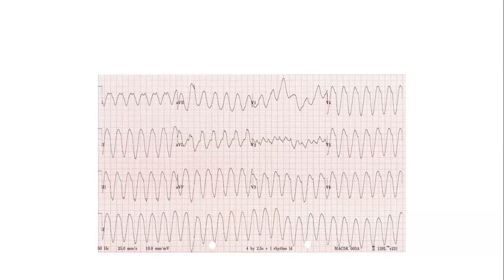It depends if there's a pulse or if there's no pulse. Okay. Hemodynamic. Usually with a ventricular tachycardia, is there a pulse or no pulse? The tachy?